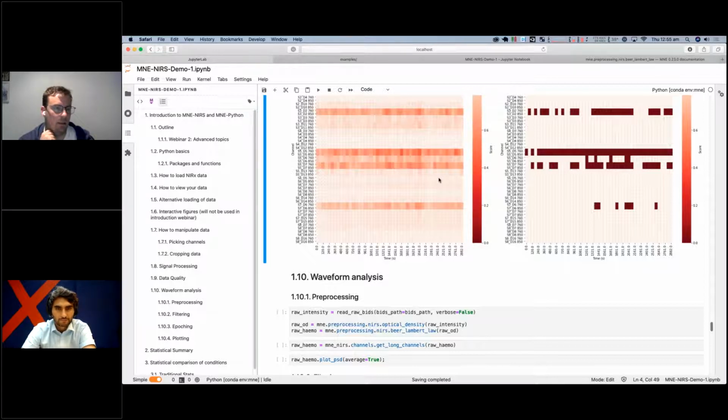Sorry, I did go over that too quick. I was just making copies because we were doing things like cropping to show you a point, and then I wanted to use the full piece of data again later. So in a standard pipeline, I would barely ever use a copy. And so we'll go through a standard pipeline now.